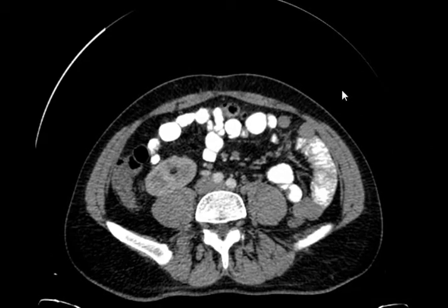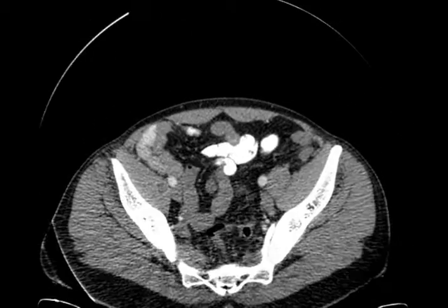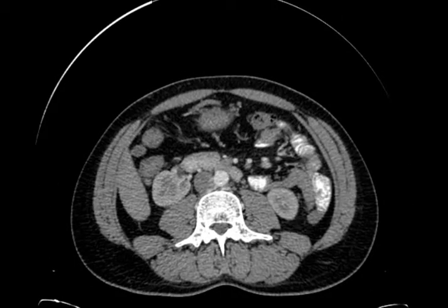As simple as that. I think we should wait also because all the contrast is not entering. Yeah. Okay. It needs a long time till it reaches the colon. You don't know when it will reach the colon. Maybe after an hour, maybe after 4 hours. So you have just a standard time, and then you do the imaging and see what's going on. But the contrast not reaching the tip, that's appendicitis. Sorry. The contrast should reach the tip of the appendix to exclude appendicitis. Well, in this case, even if it's without contrast, I would consider it appendicitis. Okay, good job.